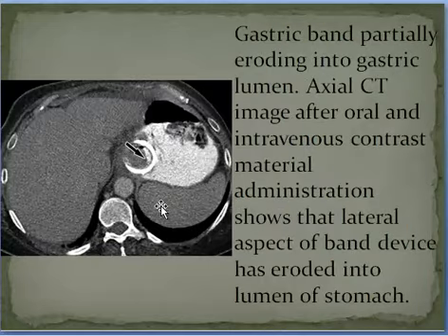Gastric band partially eroding the gastric lumen, so it is coming inside. After oral and intravenous contrast, the aspect of the band device has eroded into the lumen of the stomach. It shouldn't go inside. It should not be outlined by barium from inside.